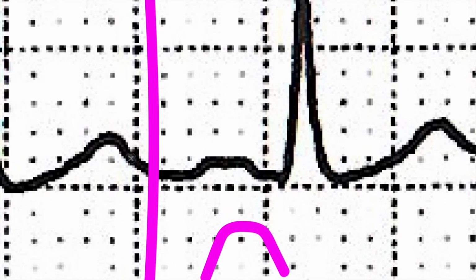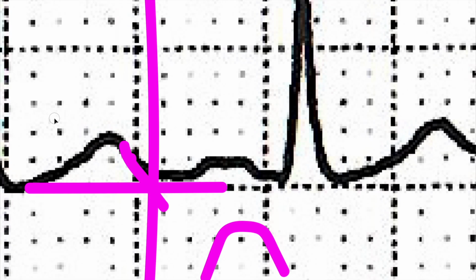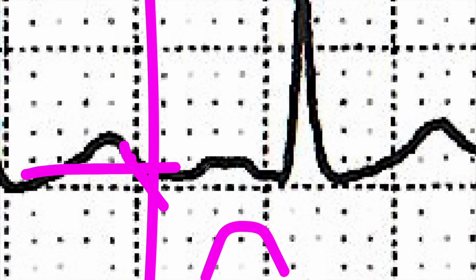And if you take a look at the T wave, the sharpest slope, I would say it's kind of dropping down like so. And yeah, indeed, it could be running into the baseline, maybe not quite. I think the baseline is up a little bit. I think the baseline is in line with this PR segment. So I don't think it's quite there, but pretty darn close.